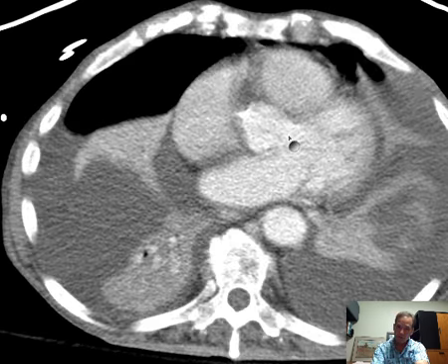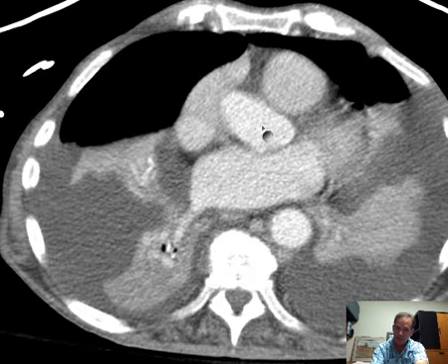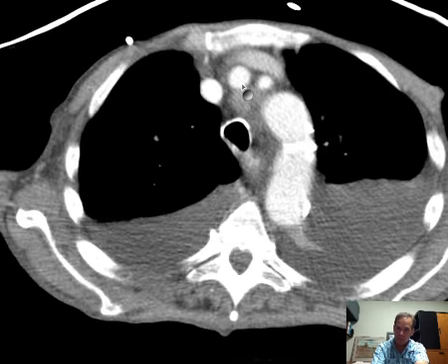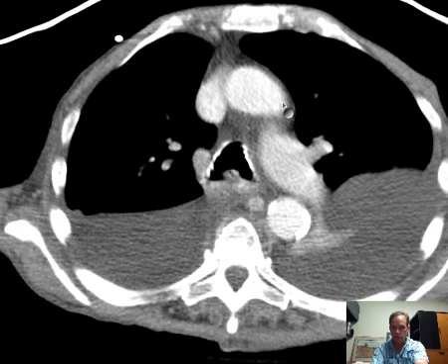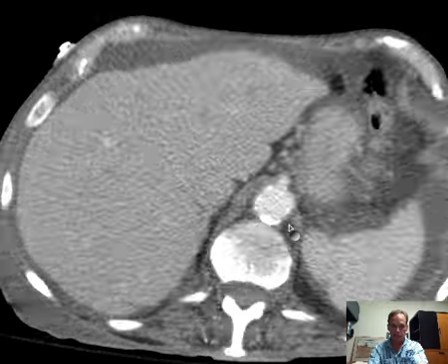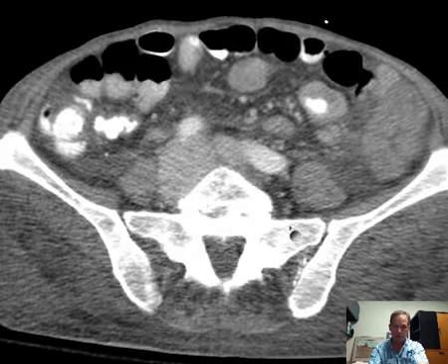Notice how the vessel arises. Here's the left atrium going to the left ventricle, and the blood gets pushed out here into the aorta. So here is the aorta going up, up, up to form the aortic arch, giving off the vessels to the arms, the head, and then coursing downward as the descending thoracic aorta to enter the abdomen and then supply all the organs of the abdomen and subsequently the vessels of the lower extremities.